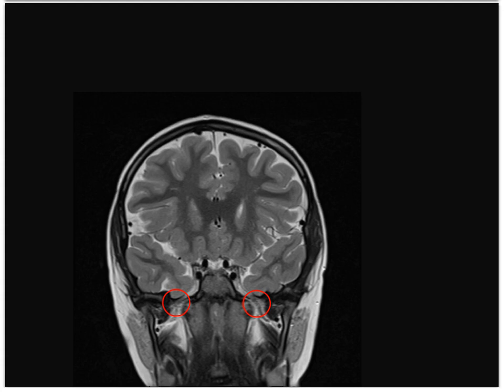Circles mark the foramen ovale, an opening in the skull on each side. May be easier to see now without the circles. And through that foramen on the left, we can see the third division of the trigeminal or fifth cranial nerve, going through this foramen to innervate motor function for the muscles of mastication. Make note that the falx cerebri, pointed out here, is small anteriorly. As we go posteriorly, it gets taller.